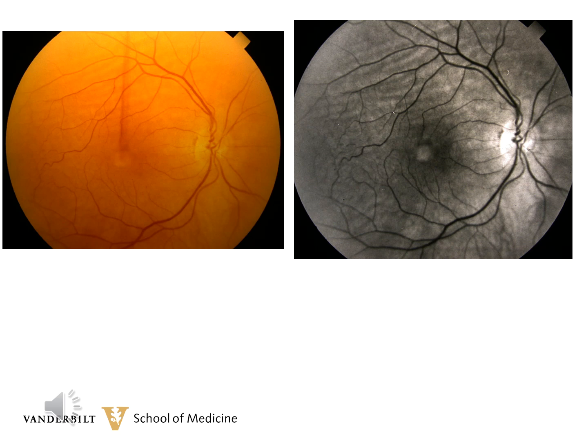She also has pattern dystrophy, which gives that yellow look to the fovea. This is a subject which will be covered elsewhere in the atlas. Choroidal folds are generally horizontal lines of light and dark pigment that you can see clinically. These can be seen even more easily on this patient on the red-free photograph.